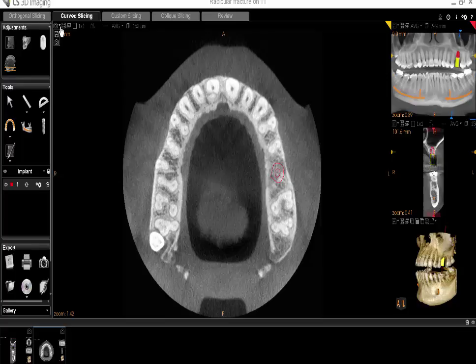If I click the drop-down arrow, I have the choice of clicking the diskette to save a DICOM snapshot of the view, which is used in more advanced reporting, or I can click the camera icon here, and if I then go to my gallery, you will see that I have created a snapshot of the single image by itself without the thumbnails to the right. This has been an overview of quick and simple image sharing with CS3D Imaging.